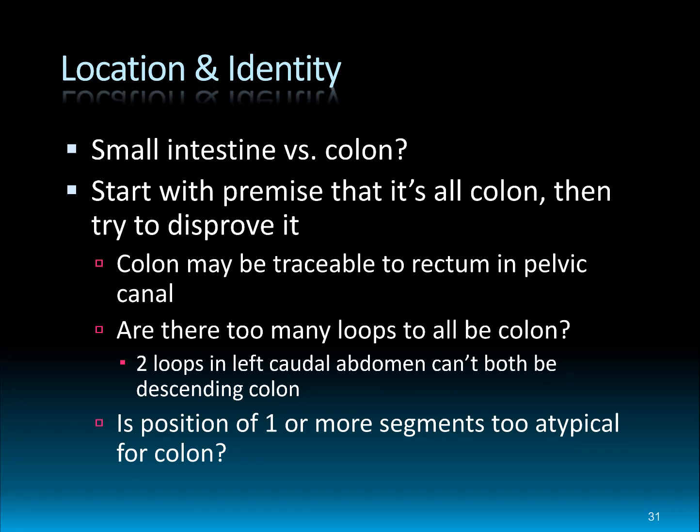So when I'm trying to figure out who's who, one thing I'll often do is start with the assumption that maybe everything's okay. Try to figure out, could this all be colon, or is something an outlier such that there's no way that all of this can be colon?